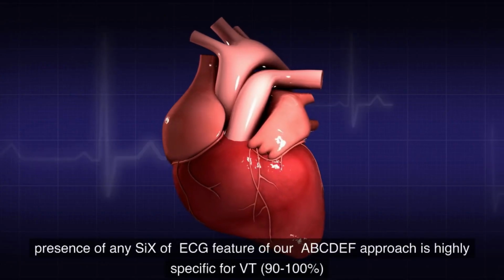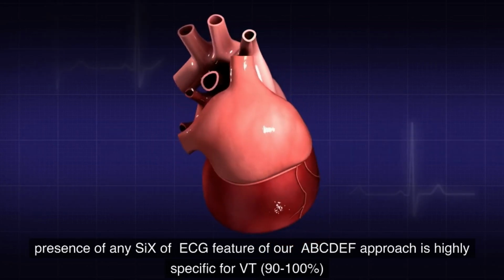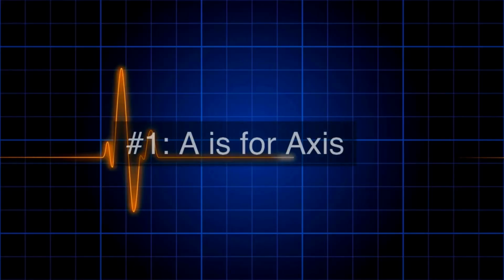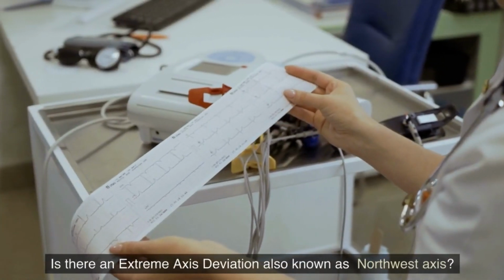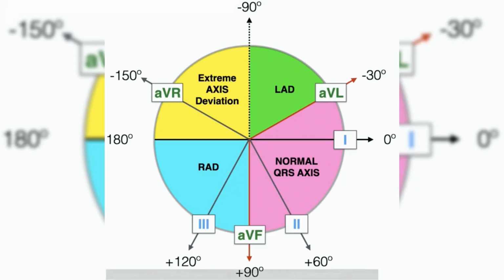Presence of any 6 ECG features of our ABCDEF approach is highly specific for VT, 90 to 100%. Number 1. A is for axis. Is there an extreme axis deviation, also known as northwest axis? Presence of a northwest axis, -90 to -180 degrees, is highly specific for VT, 90%.